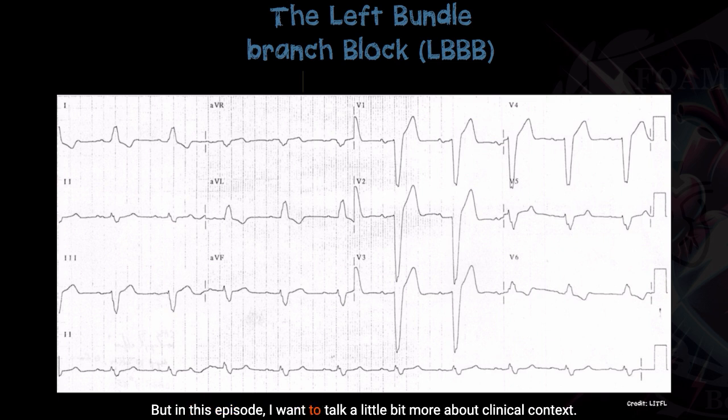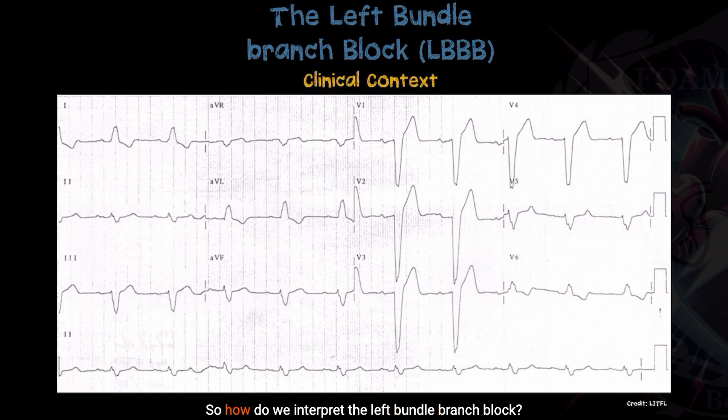But in this episode, I want to talk a little bit more about clinical context. So how do we interpret the left bundle branch block? How do we apply it and do some clinical correlations to it? So here's a 12 lead. This is a normal left bundle branch block. I want to talk about that.